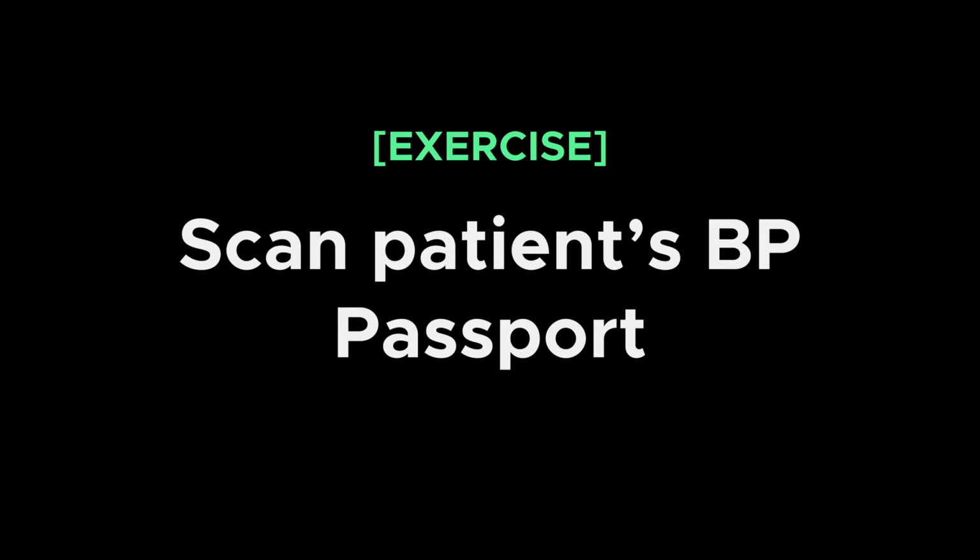Remember the patient that you registered in the previous chapter? Please scan the BP passport of that patient. When you find the patient, add a BP for them. Were you able to find your patient? If you were not able to find your patient by scanning, please pause the training. This is an important feature to learn. Continue when everyone understands how to find a patient in the app by scanning.